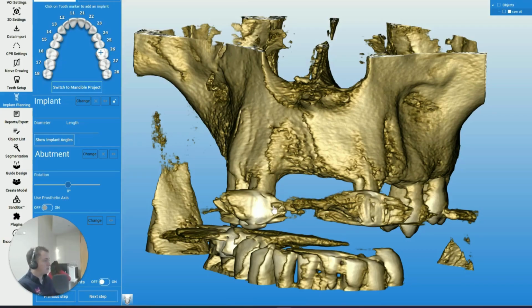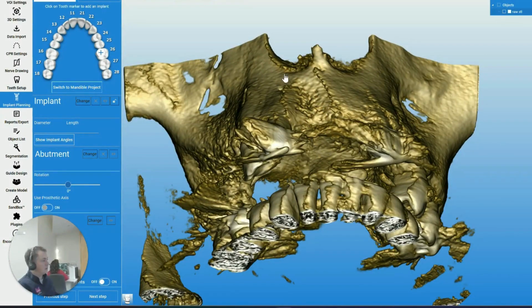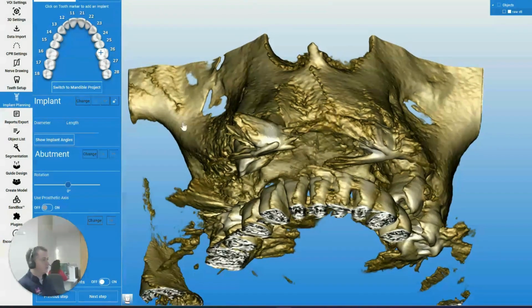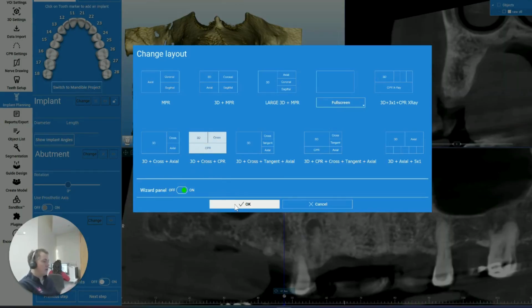So here's a prime example. This is what we're looking at. This line, or this ridge. If I mark it just so that you can see it, this here. Whenever we see this within the planning software, we're immediately nervous that there's going to be some movement in the scan. If I take you to this view, that was around about the upper right 1, upper right 2 region.